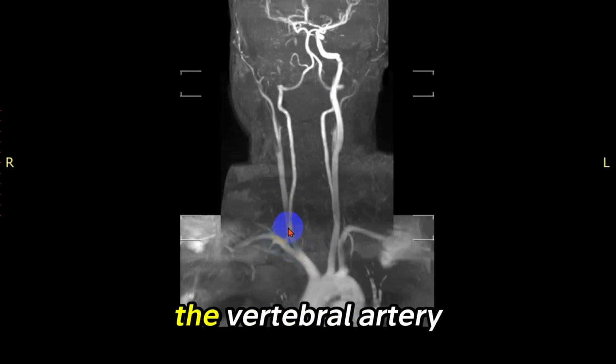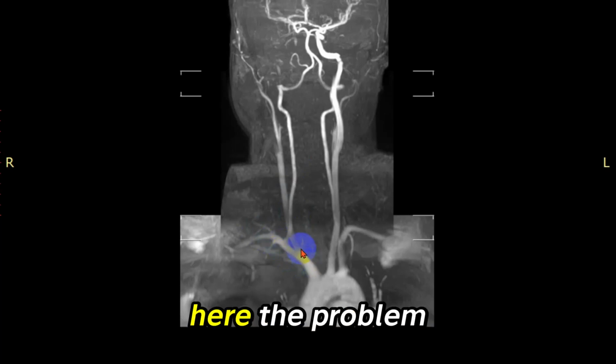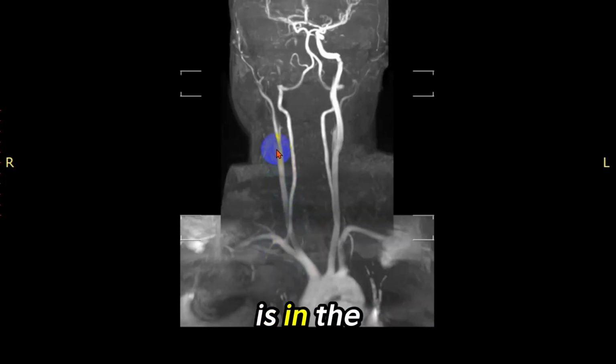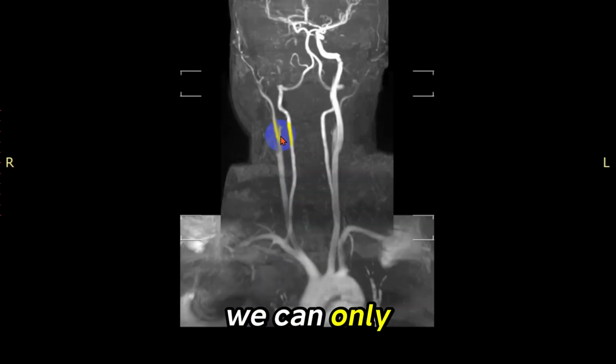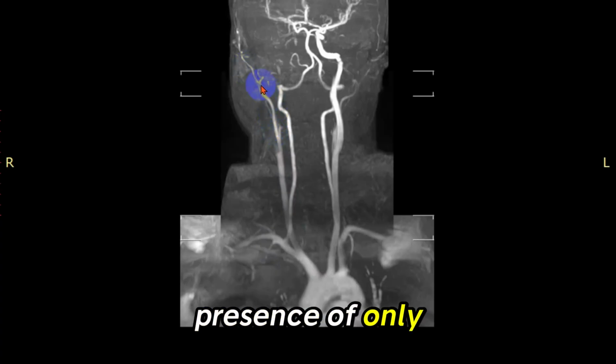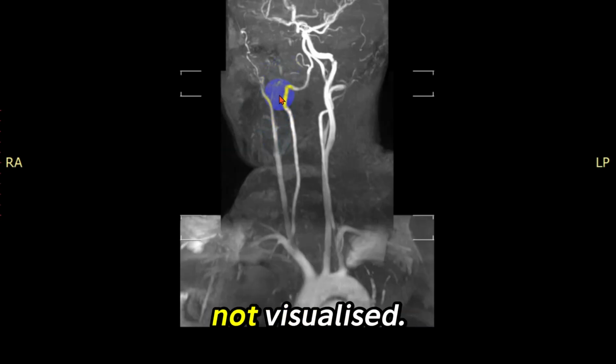Here we can see this is the vertebral artery. It arises from the right subclavian artery here. The problem is in the right common carotid artery. When it bifurcates, we can only see there is the presence of only the external carotid artery, but the internal carotid artery is not visualized.